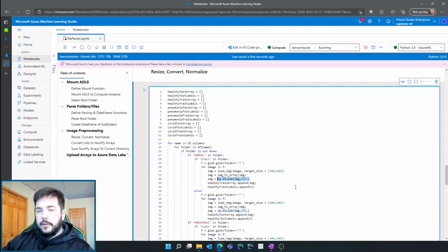The reason we do this is what's called normalization. In this case, we're reducing the variance of the values. The values will still be scaled and representative of their color. The colors will not shift. But the values will be rescaled to be between 0 and 1 versus 0 and 255. Reducing the variance helps neural networks a lot with the training process. There's more to that. I'm not going to touch on it right now, but that's why we're dividing by 255.